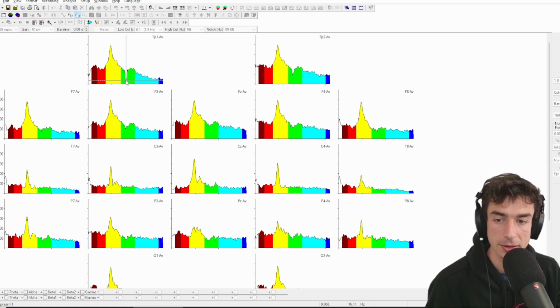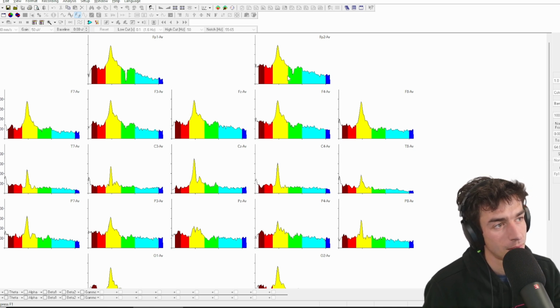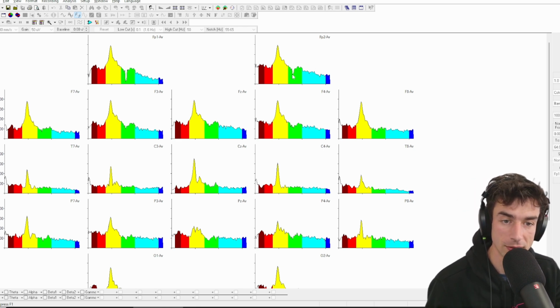Interestingly, the 16 hertz activity is the opposite of coherent, because it looks like it has a dipole that's going left to right in the front, which could mean that it is muscle activity coming from one of the sides, which means it would be predisposed to be phase inverted at FP2, even though we don't typically see muscle activity having this kurtotic of a peak. So I'm ambivalent as to the interpretation of that feature.